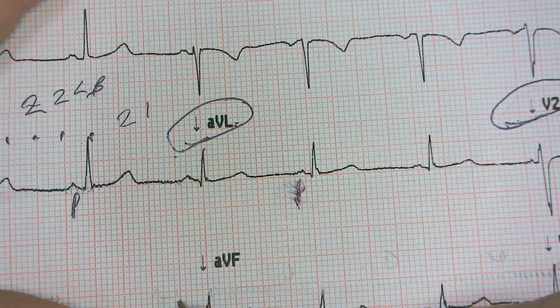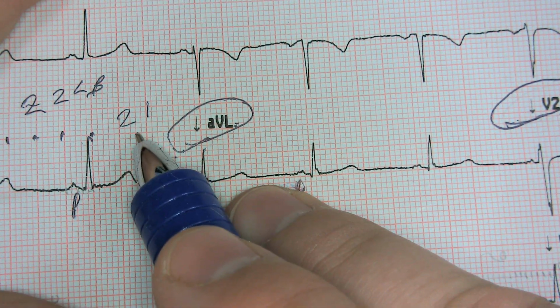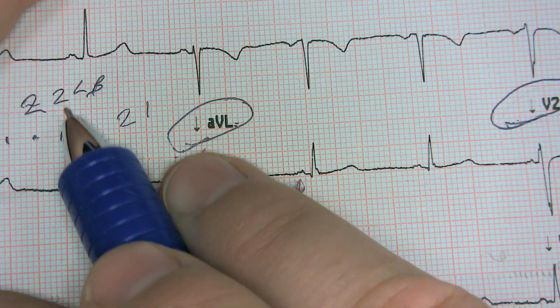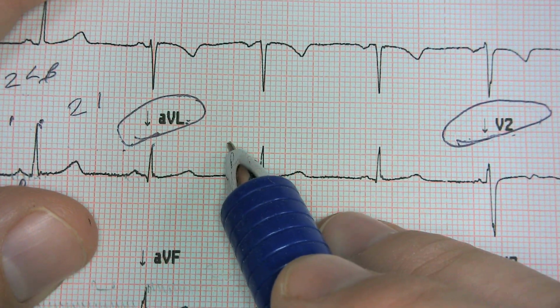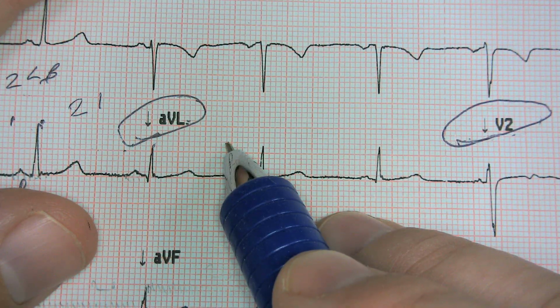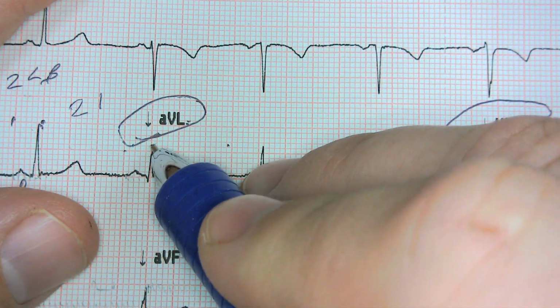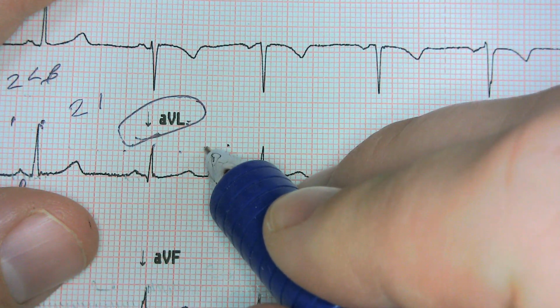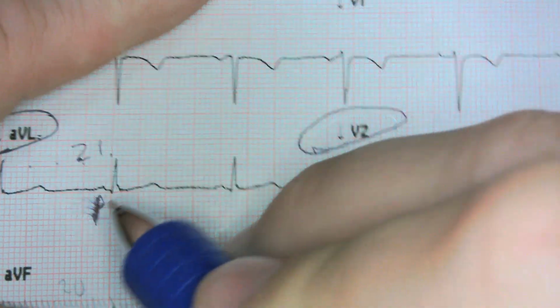21 is well within 3 little boxes of 22, right? We can be as low as 19. We could have been as high as 25, and we'd still been within 3 little boxes of 22. So now over here, we're allowed to be as high as 18. As high as 24, as low as 18. So 0, haven't gone anywhere. 5, 10, 15, 20, 21, right on the money.